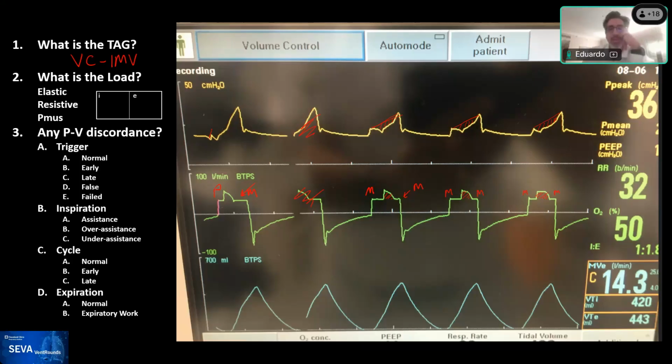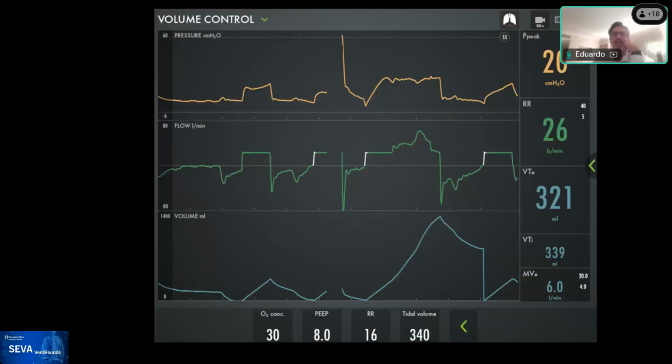I'm going to show you. Do you think I should show them the example? You want to show the sequence on that one, perhaps? Yeah, I think that's a great example from the Servo-U ventilator, where we can look at this admittedly very disorganized-appearing waveform, but believe it or not, we can still obtain useful information from it thanks to taxonomy.